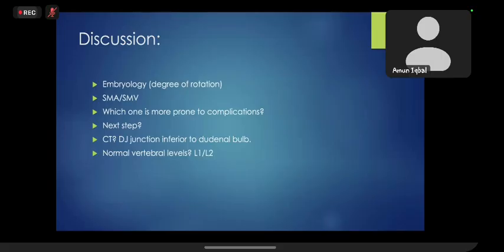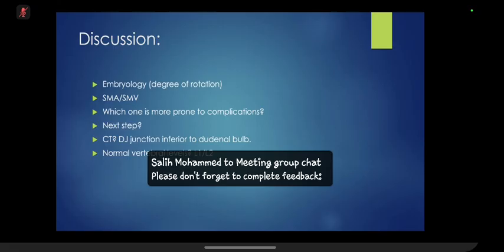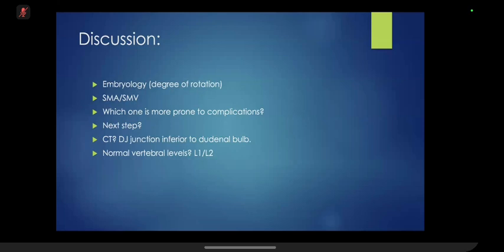Okay, good. All of you must be well familiar with malrotation. It's a very important exam case because it can be associated with a volvulus, which would come as an acute emergency finding, and the examiner would try to test your safety findings as well. So you need to know the pathology as well. Usually what they ask is what is the diagnosis here, and it's very typical on the films which I have shown. But some background is also important.